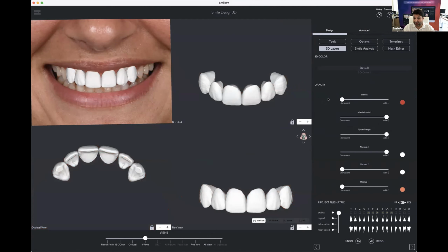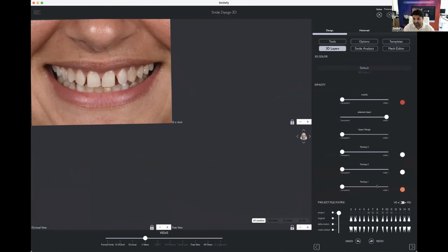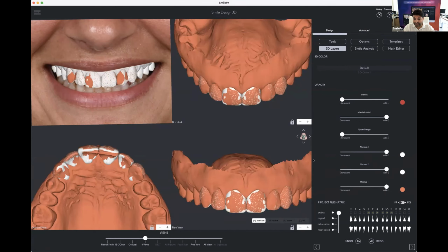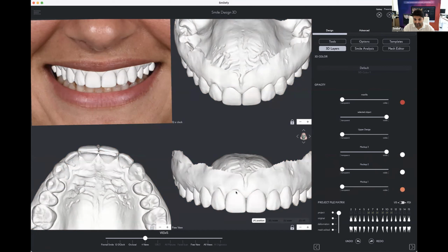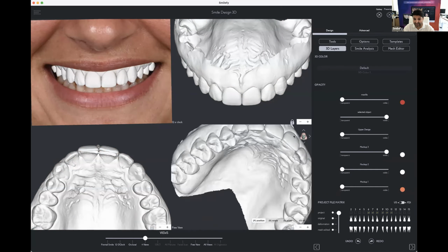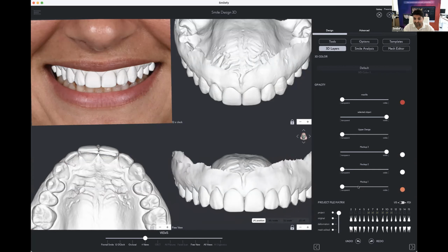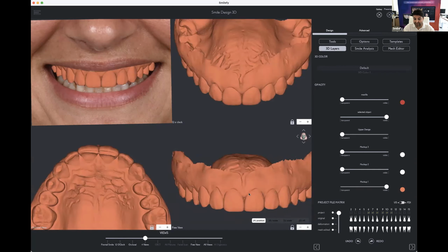So now I'm gonna hide the design and all the stuff. I have mockup number 1, mockup number 3. Different centrals, one file, all the design united. You see, that's the first mockup.